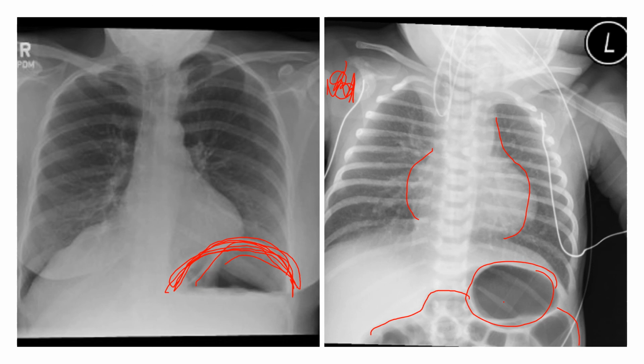So the same thing here, right? A big enough gastric bubble could cause some of that lung tissue to not expand and therefore desaturate a little bit, cause some dyspnea. So adults not as much, because we're not taking up as much percentage of the thoracic cage with the gastric bubble as it is with the kids. So it's more of an exacerbated problem with kids than adults.